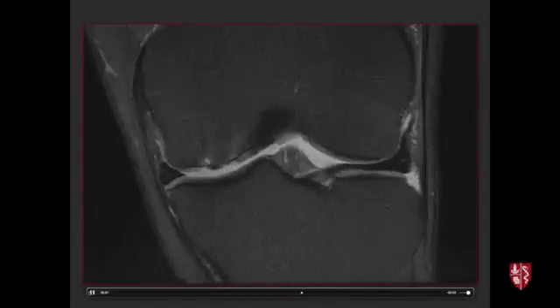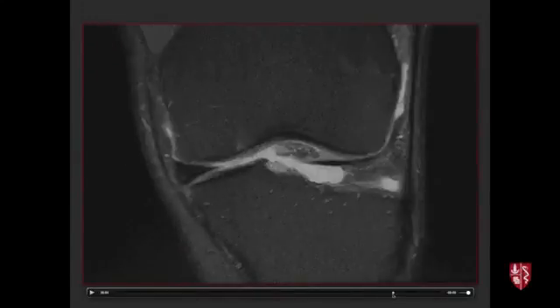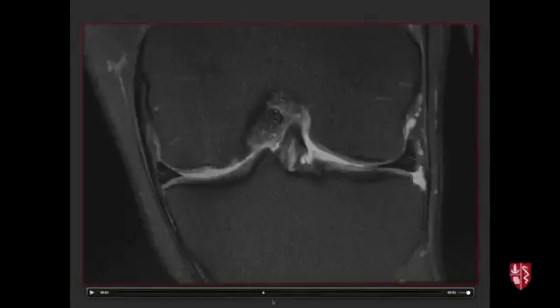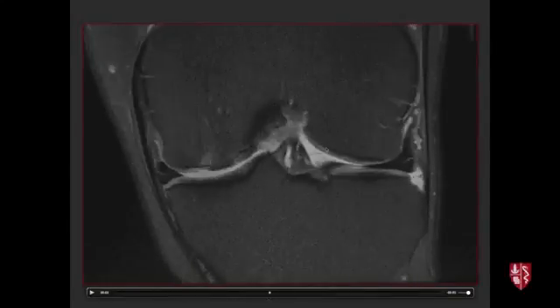Now, when we read these things, and I'll show an example when we show some cases, we have them all stacked together, right? And we have them on our PACS, and we scroll back and forth. So if you look at this, this is the lateral part of the knee here, lateral meniscus. The medial is here where you have this signal below the bone. This is a little bit of fibrosis or edema in the bone next to this cartilage degeneration. As I scroll, you can see the irregularity here, a little bit of extra bone.